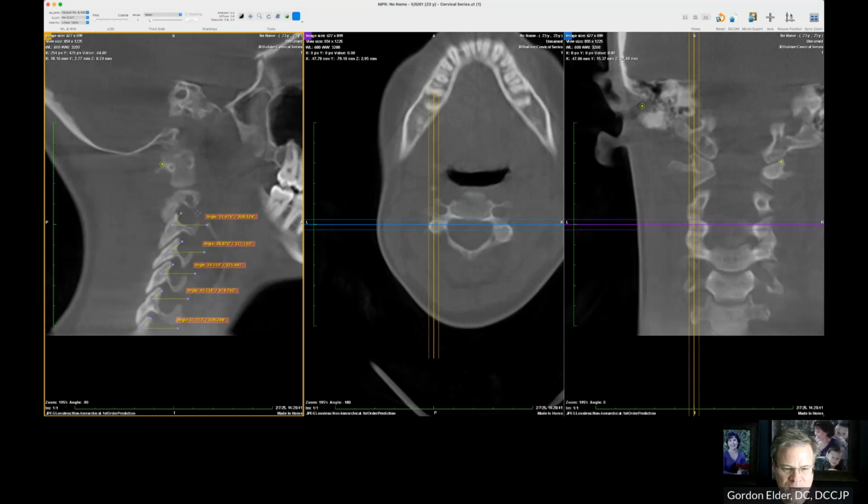All right, so now we got all the angles. So when we measure the atlas measurements, other than that convergence angle, because that's an algorithm, when I'm measuring the slope and the convexity, I'm measuring the skull because we're adjusting the atlas to the skull. When I'm measuring for the C2, C3 joint, I'm measuring C3 because we're adjusting C2 to C3. If C2 is misaligned, why would you be measuring that joint? Now, the reality is they're not usually that much different, but sometimes there can be a wedge. We're going to talk about that.